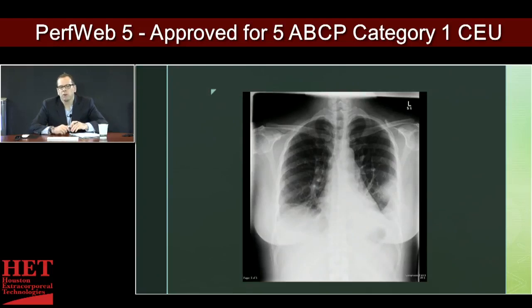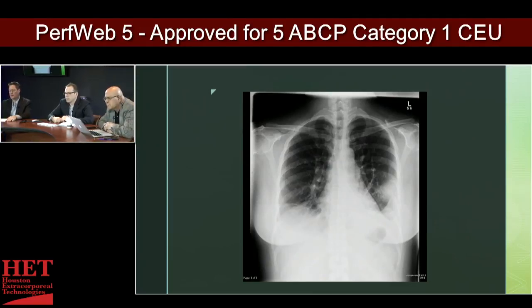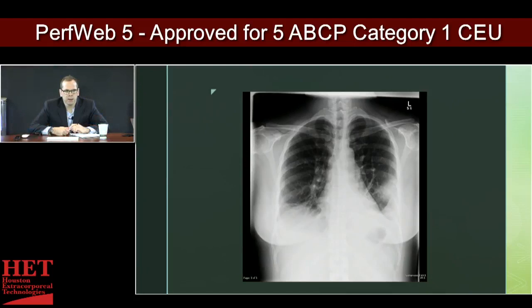This is a fairly normal x-ray with the exception of one thing, and it can be very subtle. And so obviously, the more you look at these things, the better you become. You're able to spot certain subtle defects that would be easily picked up on a CAT scan, but you may not always have at your fingertips. So in particular to this patient, we've identified the patient. We know this is the correct one that we've just been at the bedside observing. You can look at the bony structures and do a quick survey. From there you can see that everything is essentially normal.